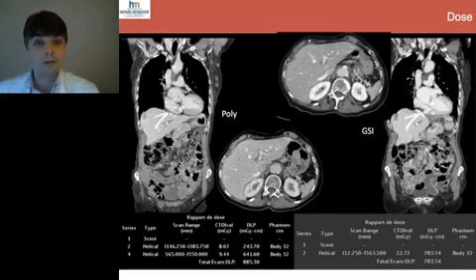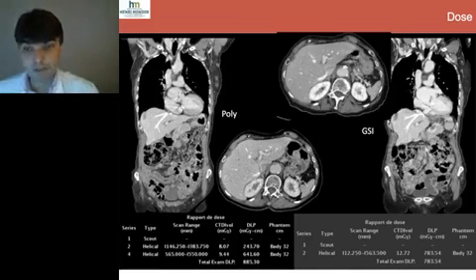So if you compare the same acquisition, you lose in terms of dose exposition. If you compare the entire patient and you can get rid of a non-enhanced phase which was mandatory, then you can even think that you can reduce dose using spectral imaging.